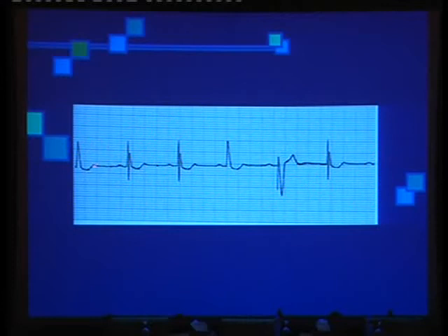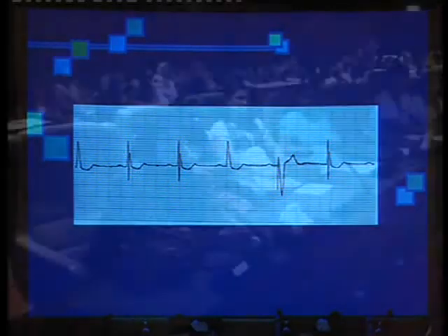I am just going to spend a little bit of time on this tracing because this is what we most commonly see in pacemakers. When you see this kind of tracing, the pacing tracing usually has 4 events, guys. Either pacing, or intrinsic or native, or pseudo fusion beat, or fusion beat, which we cannot see here. So 4 types of events.